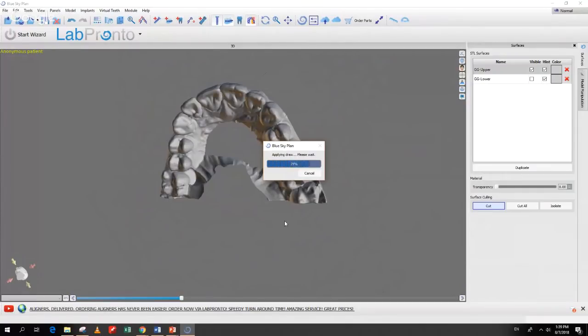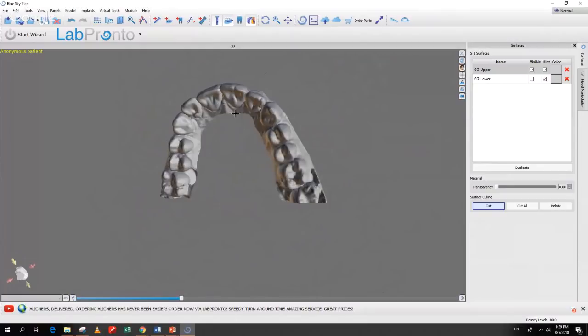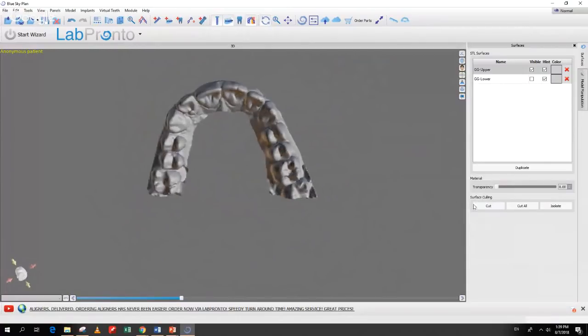And we're going to cut out the extra material on the surface. We could spend some time cleaning it up. We could repeat the cut process to make it nicer and cleaner. The third type of cut that we're going to do is just to square away the heels here so that when we go ahead and add a base later on, we'll have a good connection.